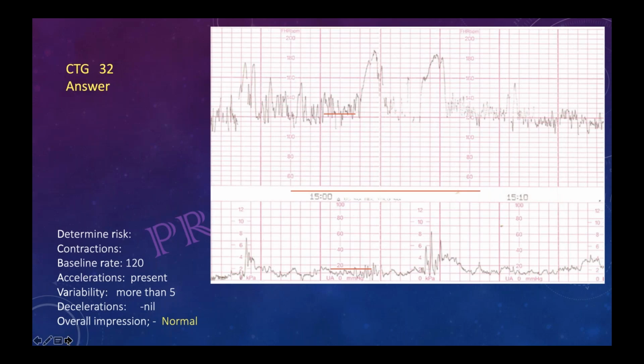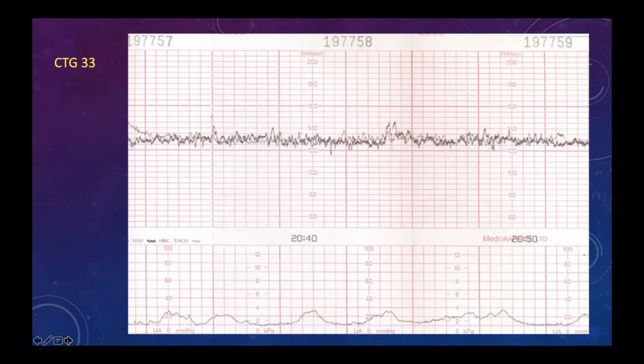Yes. Okay, so Jatinder, you want me to do this last trace? Yes, me. Twins, this one.